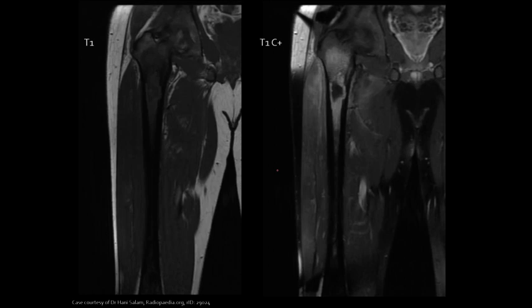Post-contrast, they've suppressed the fat in the region we're viewing, which we can determine by looking at this subcutaneous tissue here, and we can see where there's some post-contrast enhancement when comparing the two images. The central portion we don't see any contrast in. The reason for that is this part's necrosed. So this is more of a dead necrotic tissue where we have more of that inflammatory change and viable or active bacteria seen in the peripheral aspects of that region.